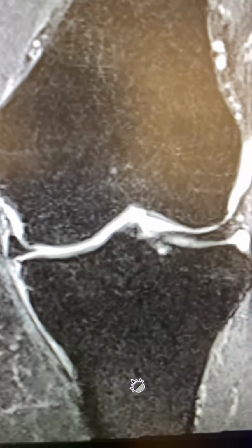Hi orthopedic friends, this is Dr. Mora. I'm going to show you how to identify a root tear.